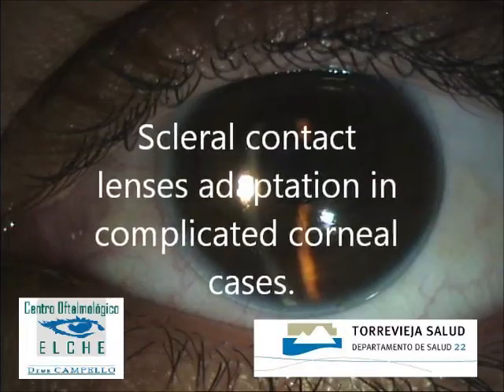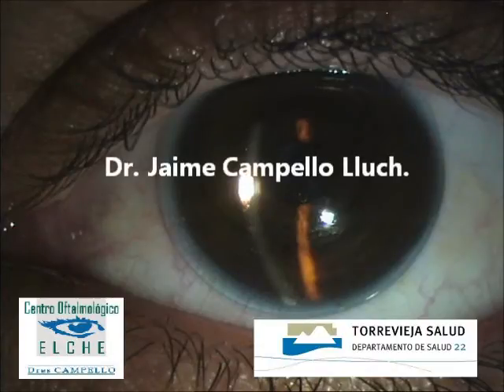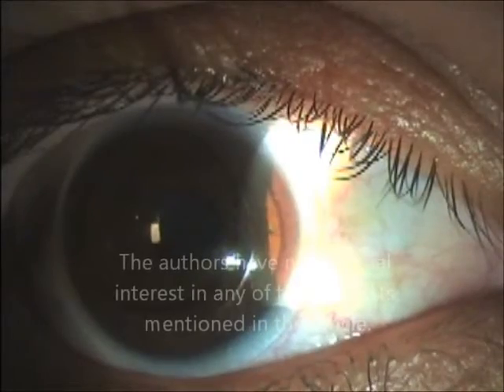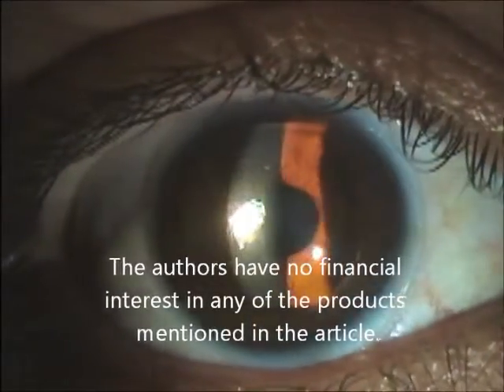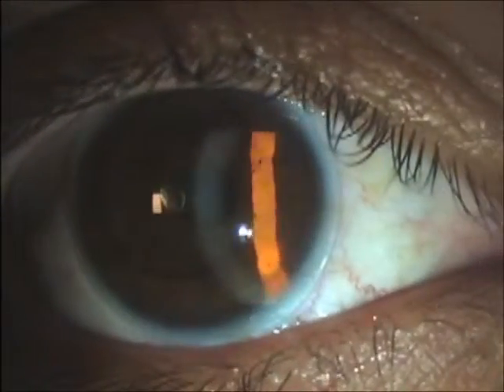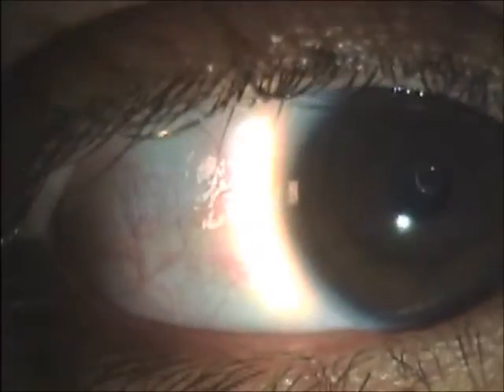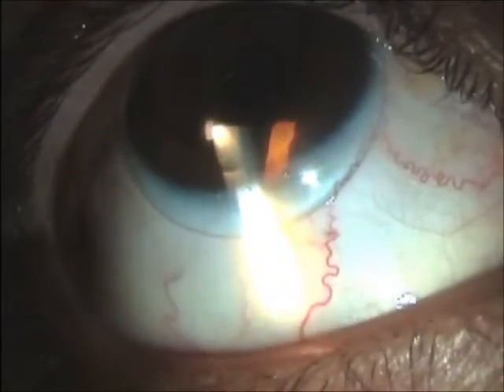Scleral contact lenses can help in complicated corneal cases. The purpose of this presentation is to show that the use of this kind of contact lenses can correct high refractive errors in patients with irregular astigmatism, improving their visual quality.